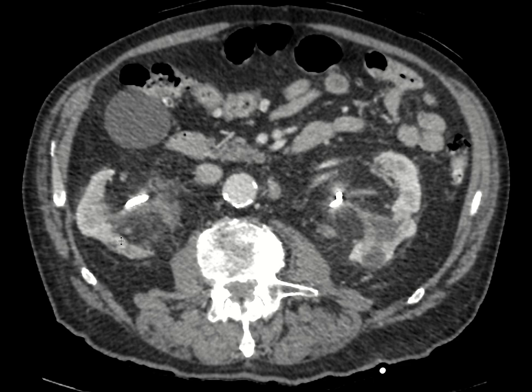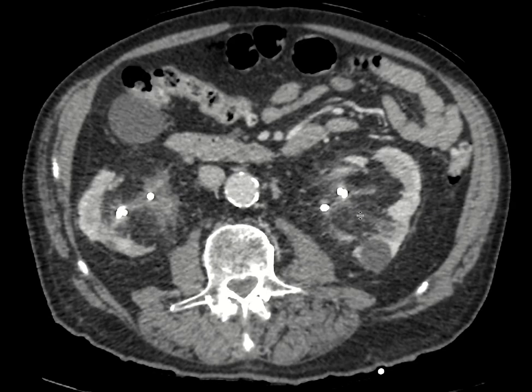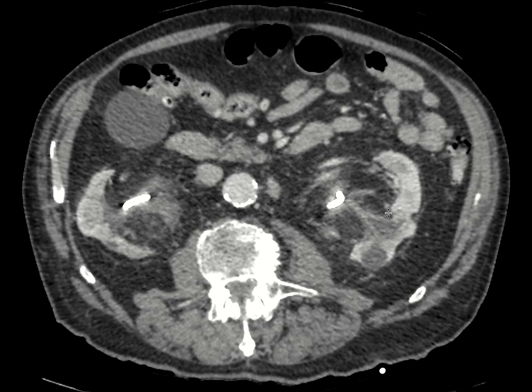have the nephrostomy tubes. Now, in the setting of a large amount of fat within the renal sinuses bilaterally, the main differential diagnosis for this is renal sinus lipomatosis and renal replacement lipomatosis. This is an example of renal replacement lipomatosis. It's a more advanced form of renal sinus lipomatosis where the fat actually replaces the renal parenchyma.